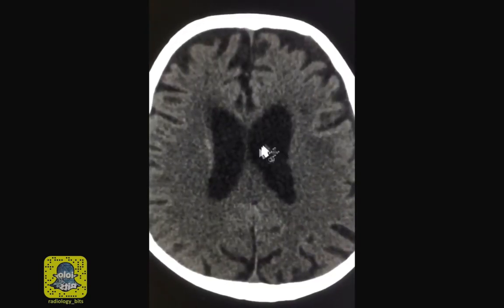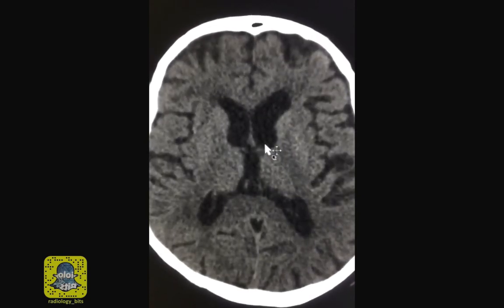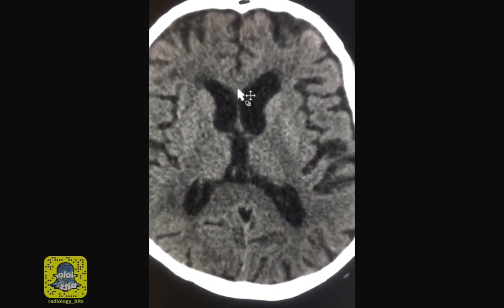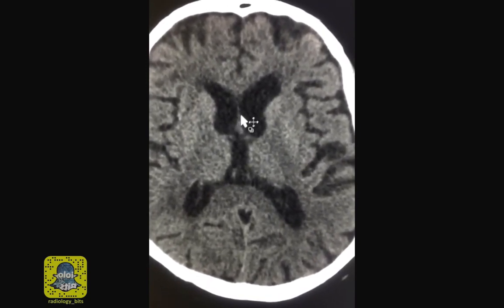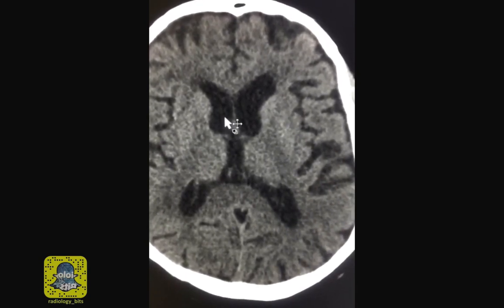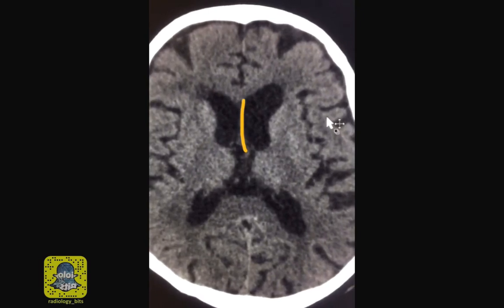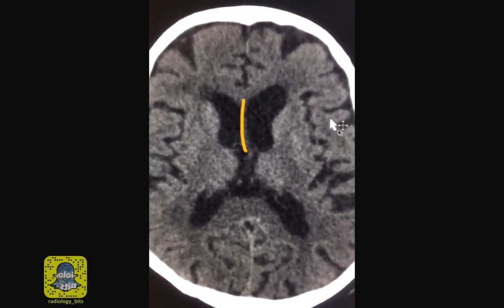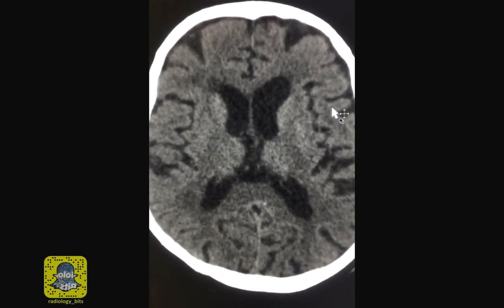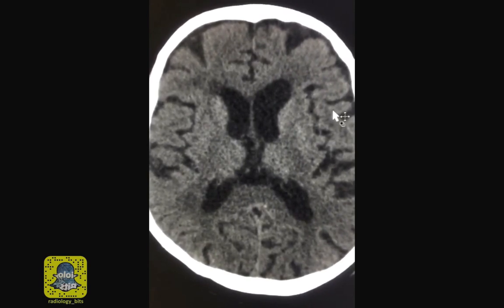This is the CSF filling the ventricular system, which we talked about in detail before. But there's one structure I want to emphasize here. There's this midline membrane that separates the frontal horns of the lateral ventricles, and it's called the septum pellucidum. So remember, the septum pellucidum is another midline structure that I need you to know for now. Now that you know the gyri, sulci, falx, tentorium, septum pellucidum, and sutures, we could proceed to the abnormal case.